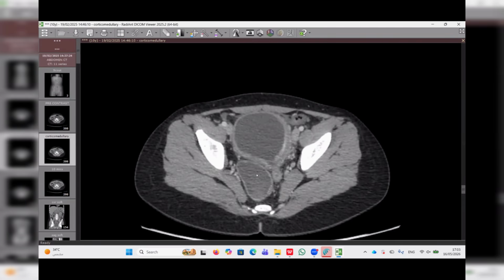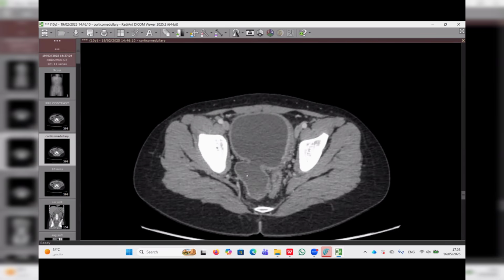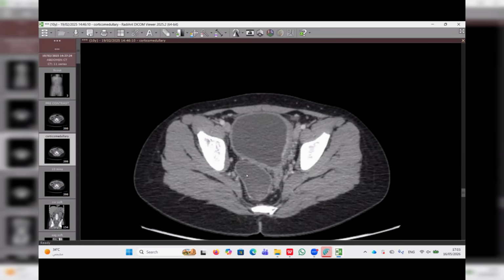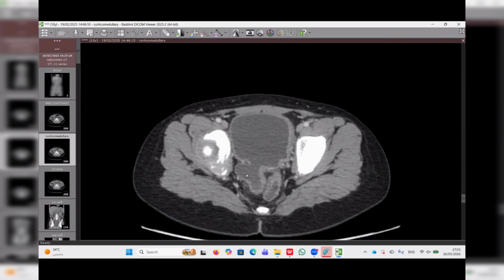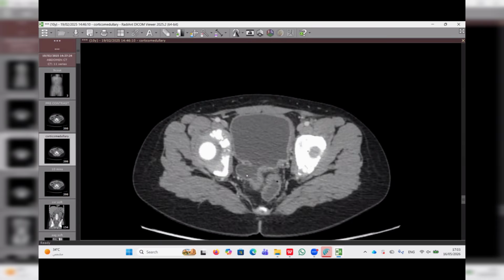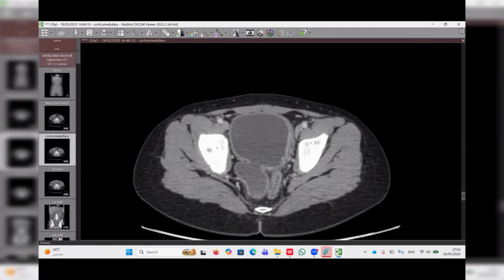It's a congenital diverticulum. Yeah. Yes. Why is it congenital? And it is also associated, they are more prominent. I think you did very, very well. This is the saccular outpouching.